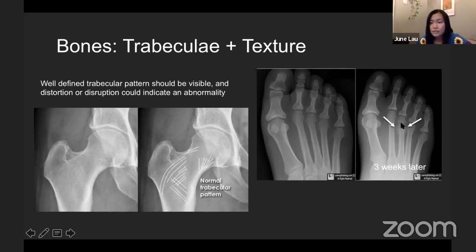And this is a callus, and if you were to see this in real life, the texture is very fuzzy. This is actually what a stress fracture would look like: really small micro stress fractures that you can't see initially, but you can see the reaction of.